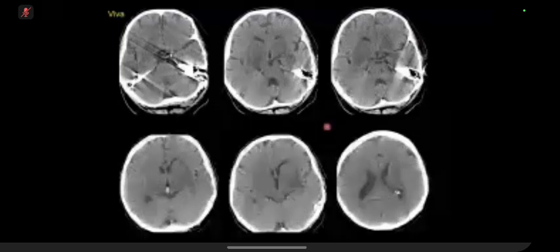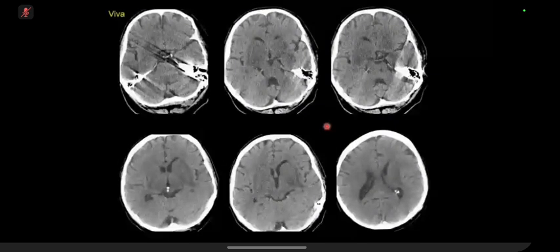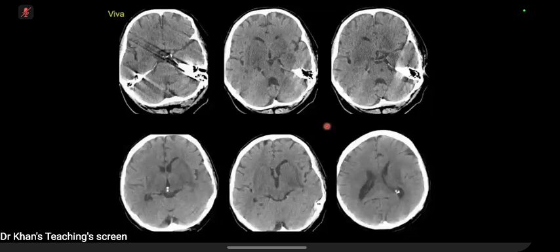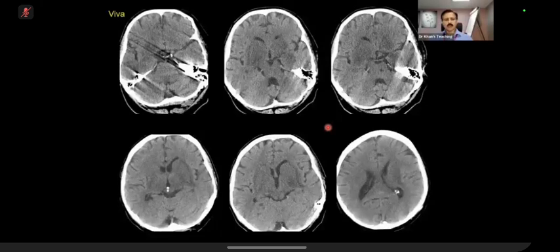Okay, so it's unenhanced CT head, and there is low attenuation change in the deep grey matter involving the thalami and basal ganglia. It's bilateral and has a symmetrical distribution. I can't see any associated mass effect or hemorrhage. So this would be in keeping with a deep grey matter abnormality, and again may represent ischemic or metabolic abnormalities or poisoning. Right. And poisoning should be up there.